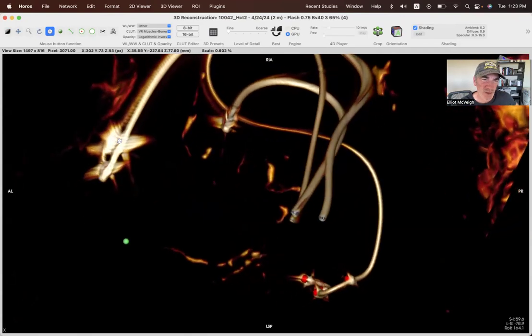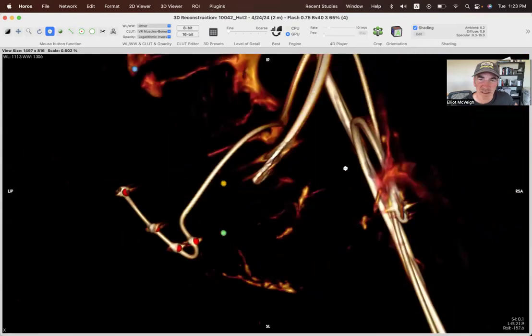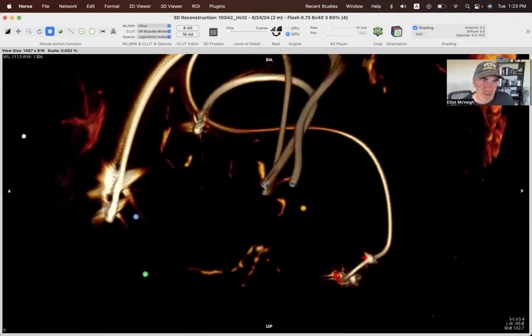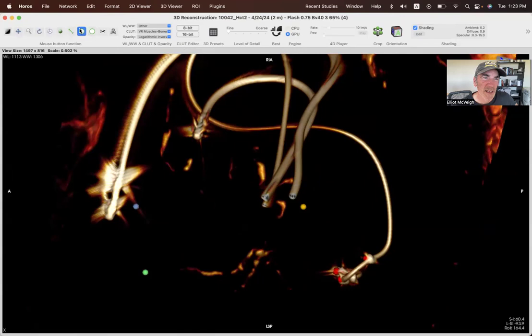Here I've got 2 electrodes on the right lead. So I'm going to, with the same activation of the point ROI, I'll say that's my, oops, my bad. Here we go. Oh no, it broke. For some reason, it won't go back into ROI mode. Let's see. Can I get it to go back if I move it around a bit? This is frustrating if it's not going to let me go back into ROI mode. No, that doesn't seem to have. All right, so let's get out of here.